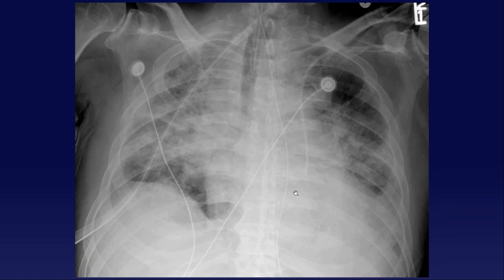Realize that there is a possibility of error in those cases. If someone's very hypoxic, blood gases won't necessarily always give you the right answer. But for something like this, this is an abnormal course. I would not use the catheter unless you're completely positive there's a left SVC, and that's where this is. I'd chat with the radiologist and confirm that this is a left SVC before using it, because once again, an arterial catheter could have a similar position potentially.